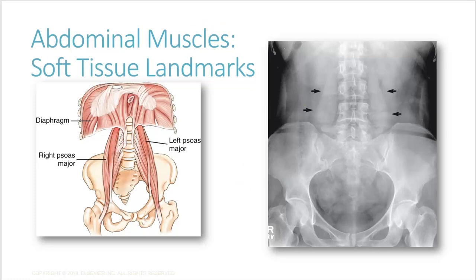And that's why it's called kidneys, K, ureters, U, bladder, B. So it's called a KUB. On a KUB, we always have to include the pubic symphysis right here. A symphysis is a joint, and this is where the pubic bone is joined, so it's pubic symphysis.